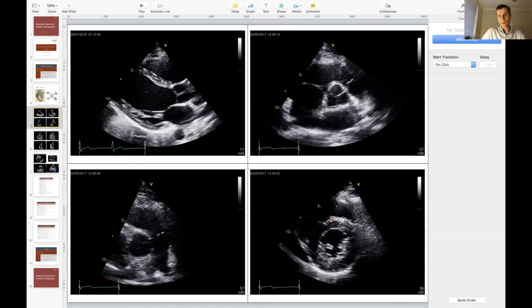If we go over here to the parasternal short axis view, we can break things down a little bit further, and without leaping too far ahead, what we can certainly see are the anterior, lateral, posterior, inferior and septal walls. Okay, so anterior, posterior, key ones here to remember. This is lateral and this is more septal. I hope that answers that question.